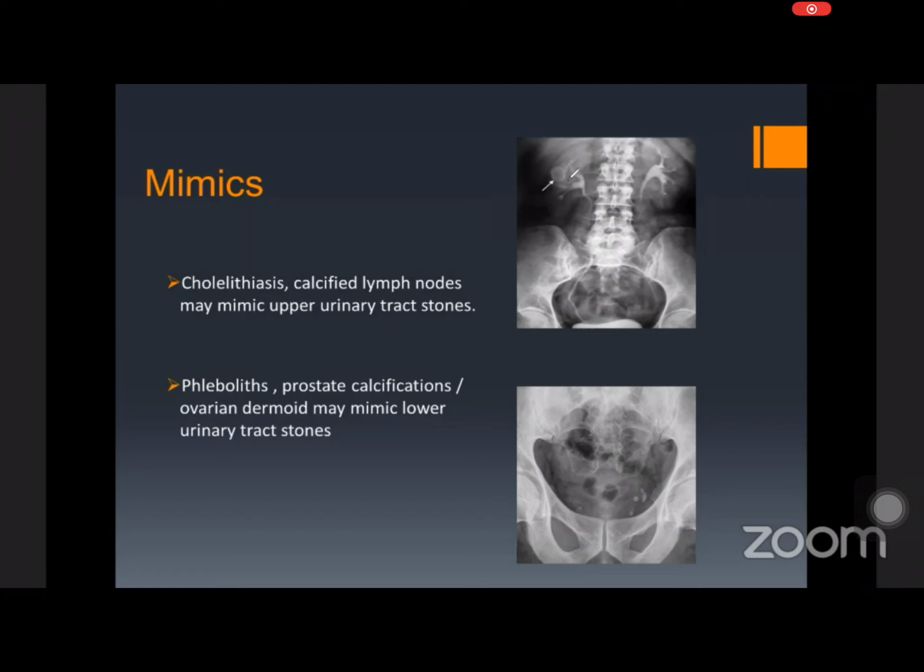So how will you differentiate this? We'll have to do a lateral imaging or oblique imaging to identify the exact position of the gallbladder stone.